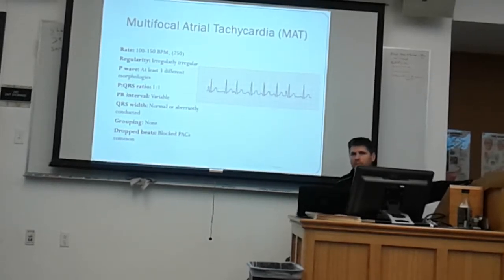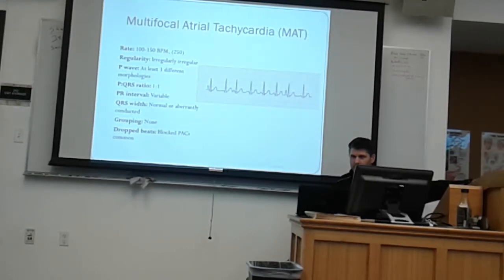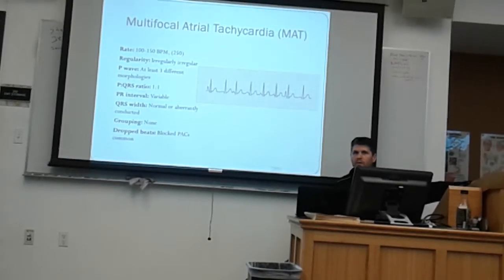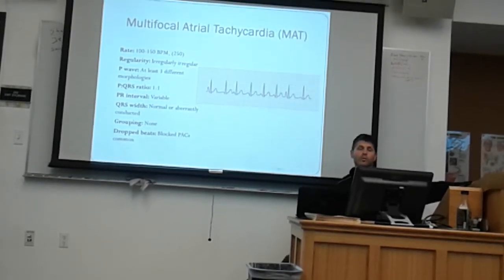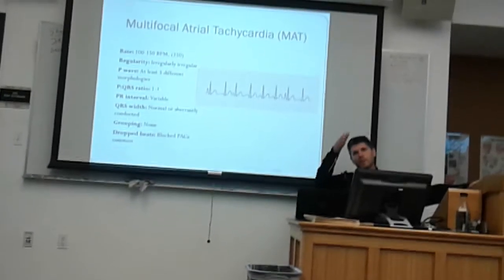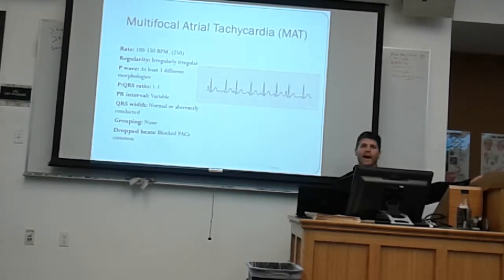So you're also showing us that multifocal atrial tachycardia could be irregular and regular at the same time, if there are certain 3 spots? Yeah, you might see a pattern to it. If the AV node creates a pattern off of the timing of when those come, then you'll start to see some sort of a pattern to it at the end. Okay. Yeah, that's right.